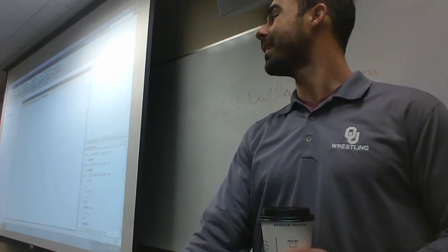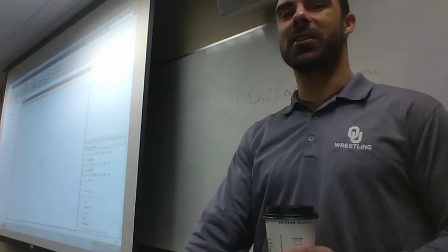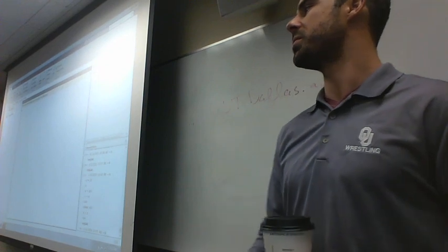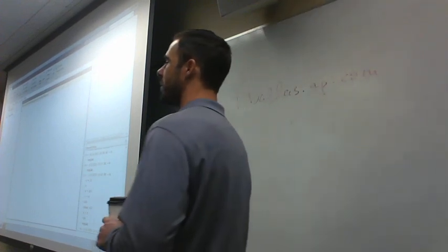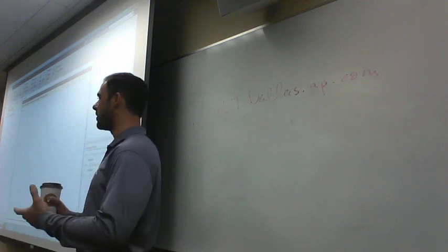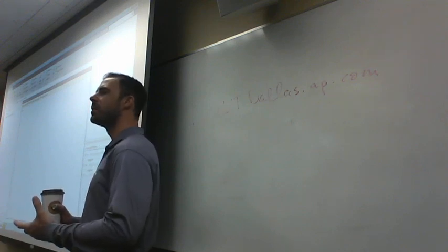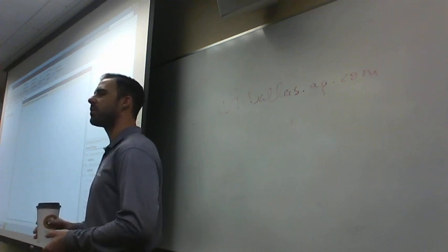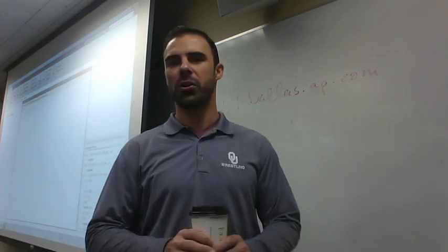Browse what? This little guy, right? All right. So what does this do? Browse for folder. What's the intention of this command, if you were teaching your little brother or sister what's happening in your college class? What are you going to tell them that this is going to do? It just sets your directory for where you're going to pull your files from.